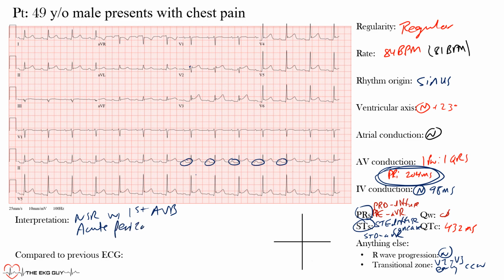So this patient, I said, presented with chest pain, and just to note, compared to his previous one, he had normal sinus rhythm. So these are all new findings. So acute pericarditis, a few things I want you to know. He came in with chest pain, okay, and it was retrosternal pleuritic, meaning it occurred when he was breathing, and it was worse when he was lying flat, and relieved when he leaned forward. He was somewhat short of breath, that I didn't mention here, okay, but he has a normal rate.